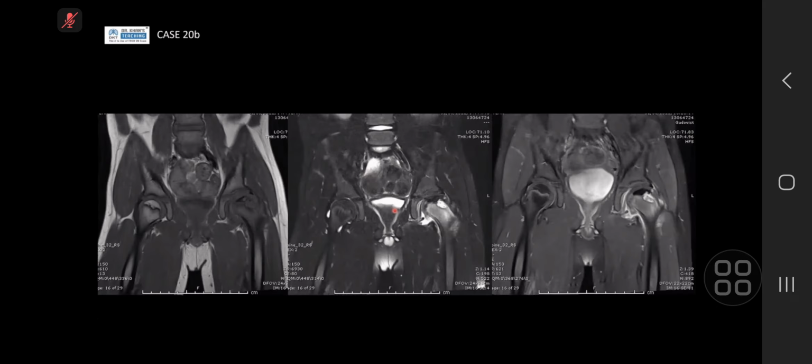And when you look on the MRI, so that's T1, T2, and post-contrast, that lucency corresponds to this low T1 or isointense T1, high T2 lesion within the metaphysis with a little bit of contrast enhancement. Some joint fluid, but not much in the way of synovial thickening, because all of this is probably just joint capsule. So this is a trick question, and I think it also tricked us all.